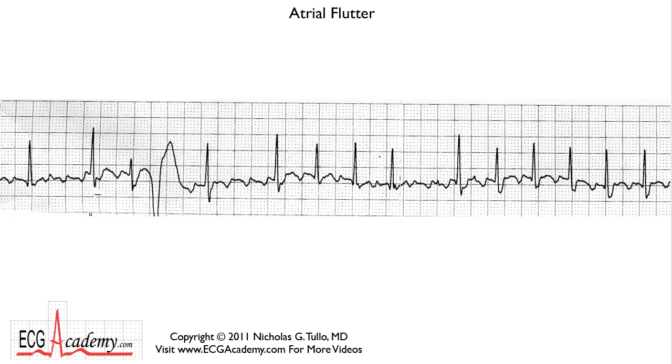So here's a great strip, and when you look at the forest, you see that it is very irregular here. You've got a few very long intervals and an even longer one, and then you've got a bunch of short intervals, and it seems to be irregular but without any pattern to it. Most of the QRS complexes are very narrow, but you do have one wide beat here.